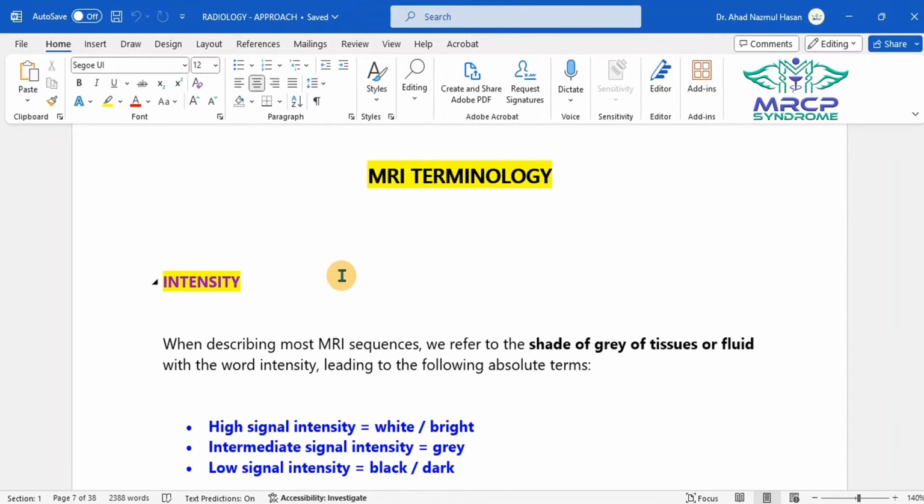And also we often use the term edema. Edema in the normal sense is the swelling or inflammation caused by accumulation of fluid in the tissue spaces. And edema can be seen in an MRI as an area of increased signal intensity. So edema will look like increased signal intensity, or hyperintense. And edema usually indicates an underlying injury or infection or other medical condition.